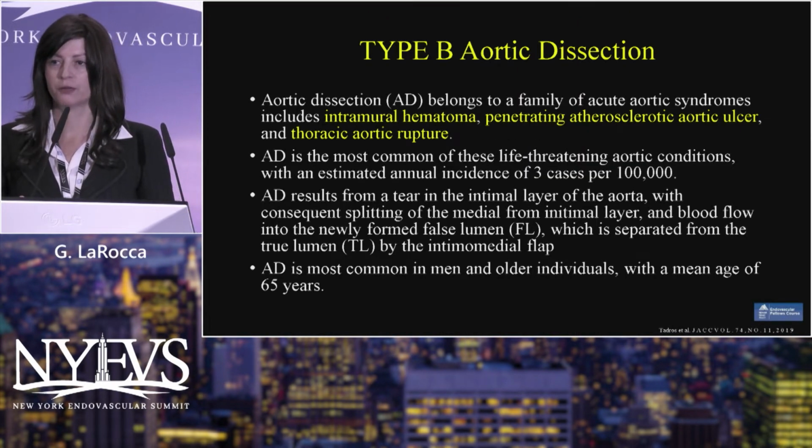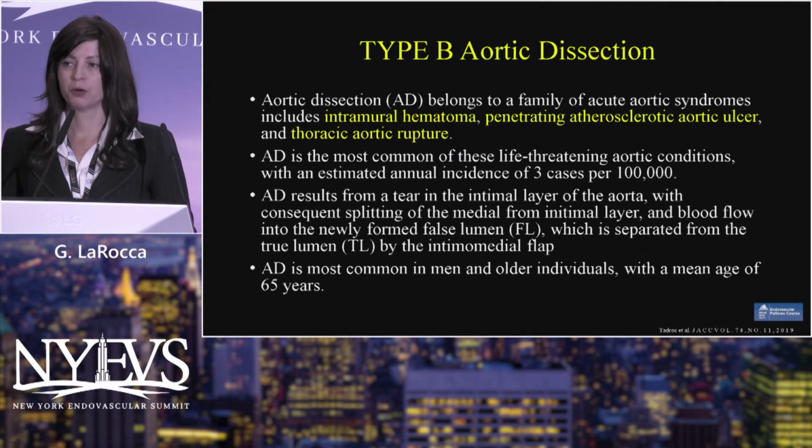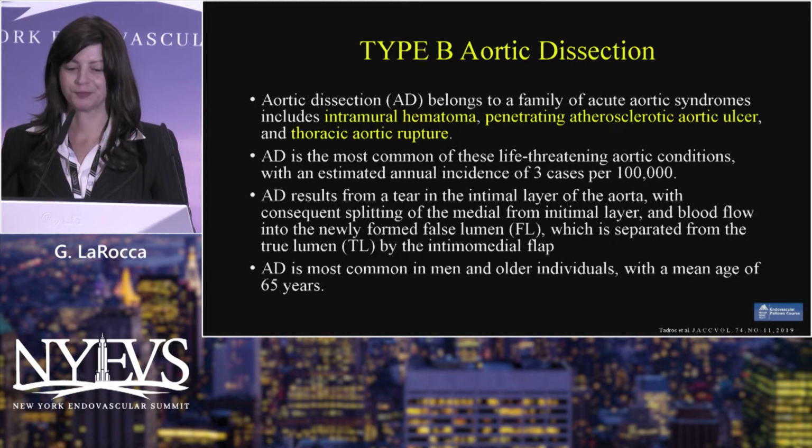I'm going to go over the aorta, kind of leave the lower extremities for now, because this is what we do mostly. And when I'm sitting down with the fellows, teaching them CT and how to read aneurysms and dissection, this is where we usually focus. So just bear with me.